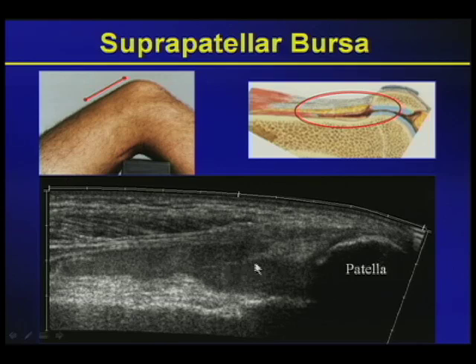We do not see the lipohemarthrosis of an acute fracture, but here you could see the hemarthrosis in this individual. And so don't forget that aside from characterizing the intraluminal portion of the distended suprapatellar bursa, also try to assess what's happening to the synovium, which usually should be imperceptible. In this case, we could see that it is indeed imperceptible, so it's more an effusion, a hemarthrosis, rather than a proliferation around the suprapatellar bursa.